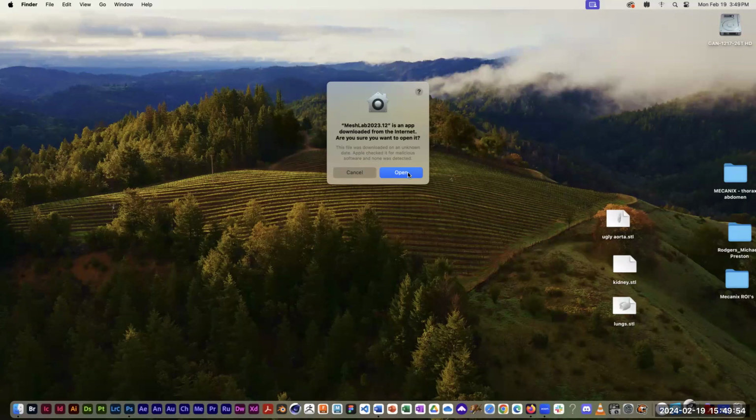I mean, I kind of want people to play with them just to see what they do. But you can then pick whichever one you want. No, you don't have to do 3 different renders if that's what you're asking. You're just gonna pick one to render it.